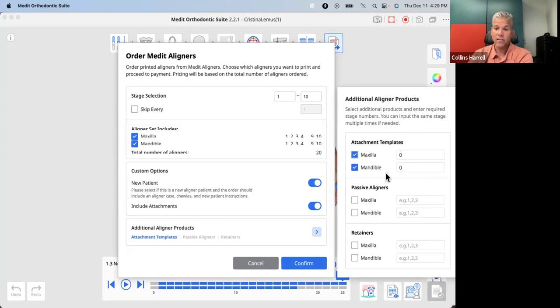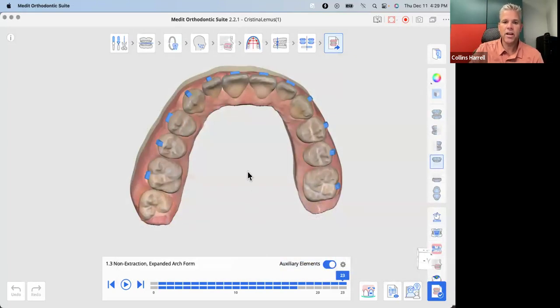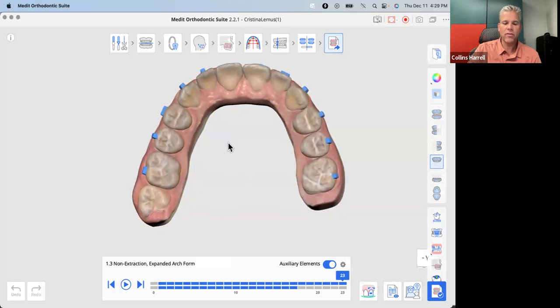But currently, if you want, at 3, you would say 3. That doesn't mean I'm getting 3 templates. That means I'm getting templates to start at stage 3 instead of stage 0. So that's how it's programmed currently. So great. Did you have any other questions about that one while we've got it up, Sylvia?